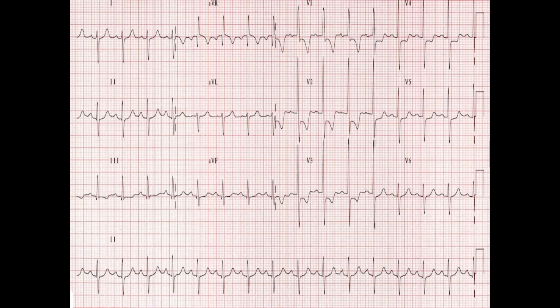So let's move over to our ventricular blocks. Do I have a bundle branch block? Nope. Oh, it's kind of on the borderline, but narrow QRS complex. Do I have left ventricular hypertrophy? So I take the deepest S wave in V1, V2. Looks to be V2. That's got like 5, and 8. Tallest R wave in V5. So 5, 10, maybe like 13. So 8 plus 13, 21. We don't have that criterion.